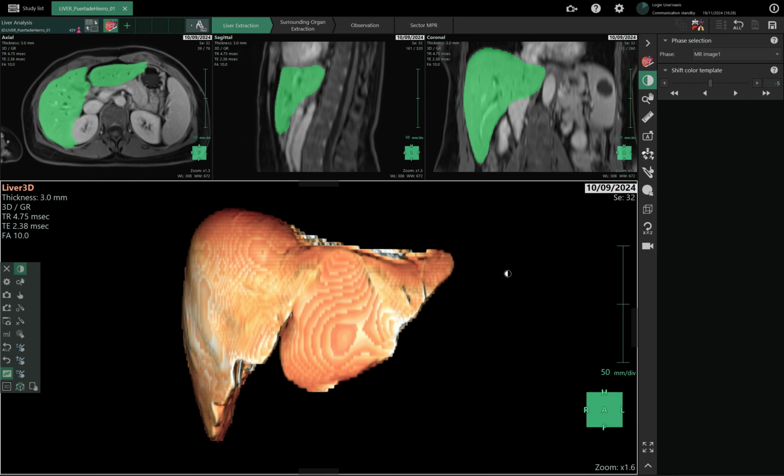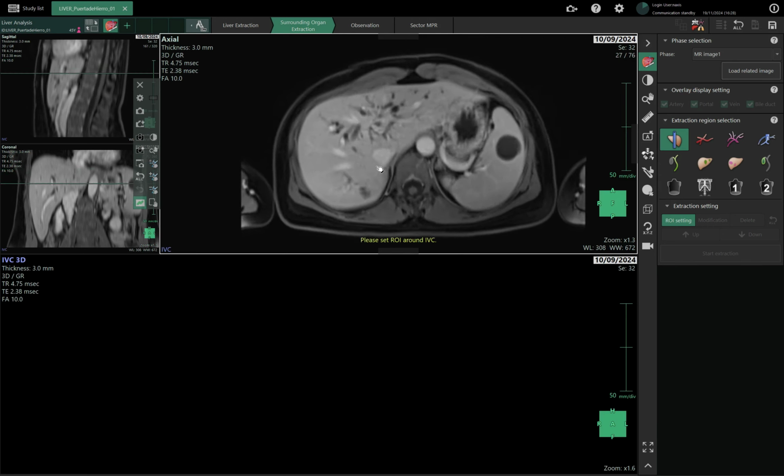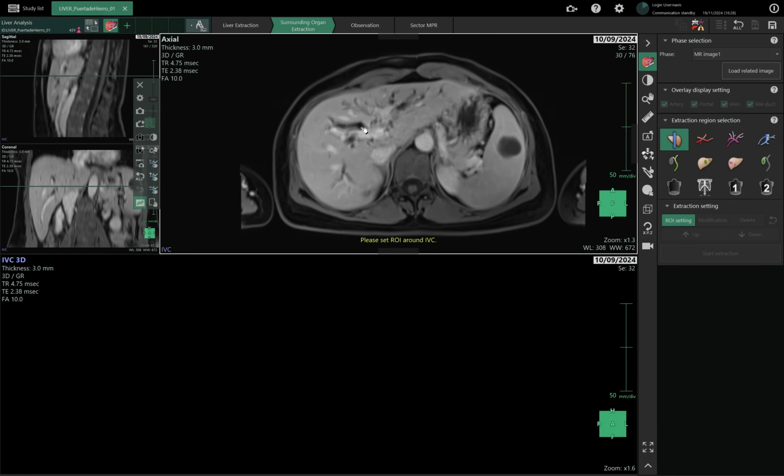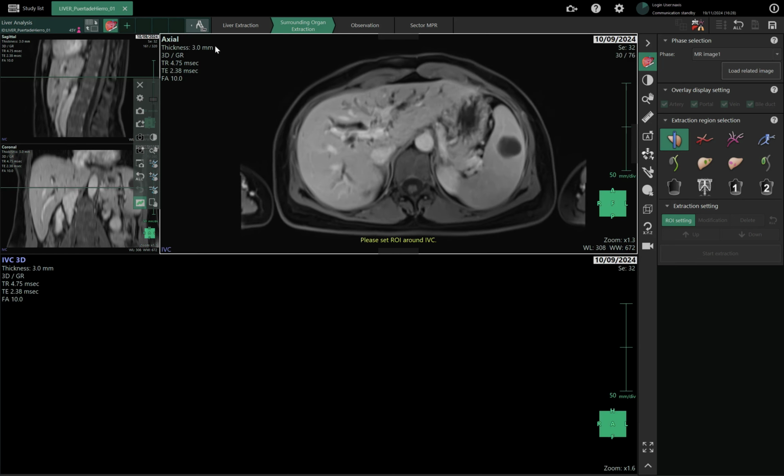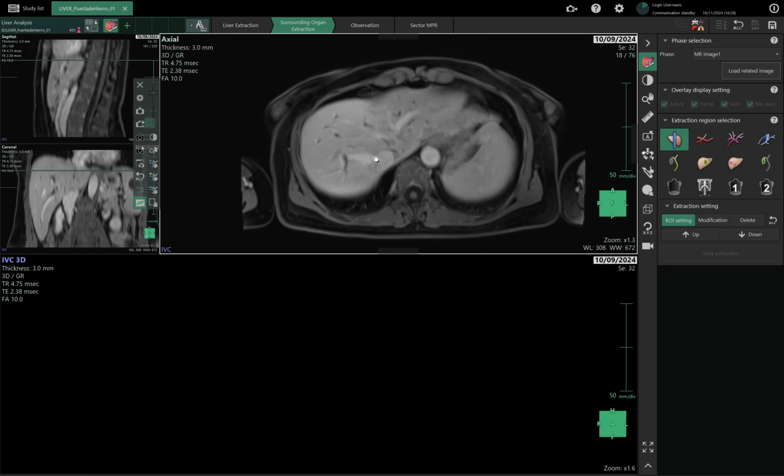Yeah, it's 100% manual. So yes, in these cases, it will be quite difficult. You will have a good visualization here, for example, for a bile duct, but vessels will be almost impossible to work with at 3 millimeters. For God's sake, possible, but anyway, if it is the only thing you have, you can give it a try. So the extractions are completely manual. You have to go like in the old days when I started to work with this application, drawing the ROIs here and there.